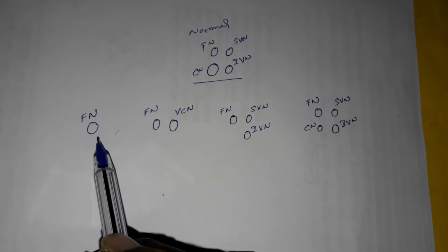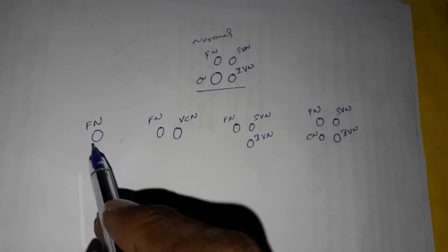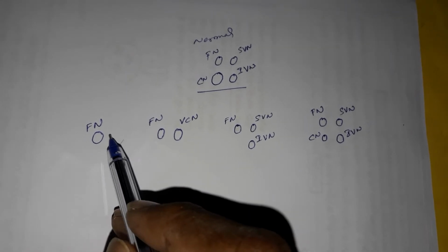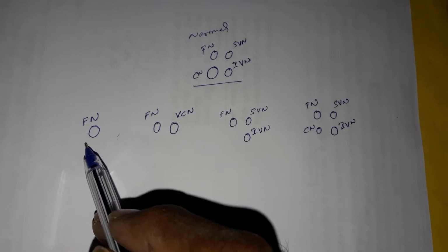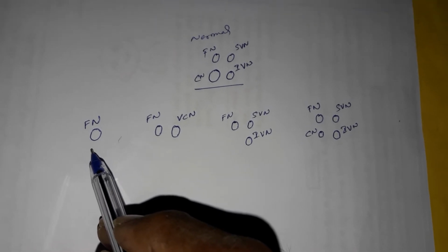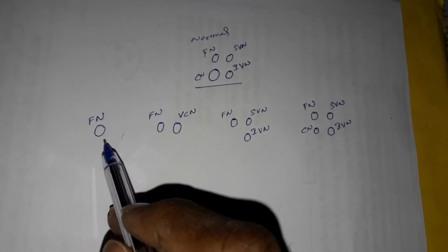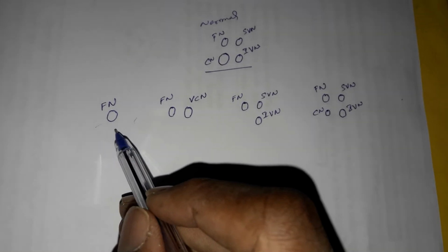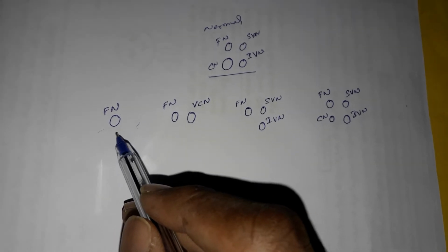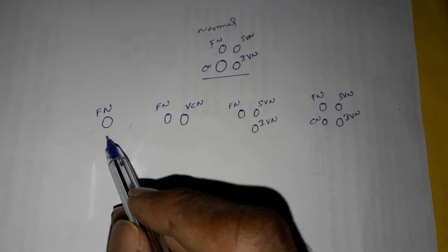So in oblique sagittal view, if only facial nerve is seen and no vestibulocochlear nerve is seen, it is type 1 vestibulocochlear nerve aplasia. There is no vestibulocochlear nerve. Here there is no point of cochlear implant. Directly we have to do auditory brainstem implant.